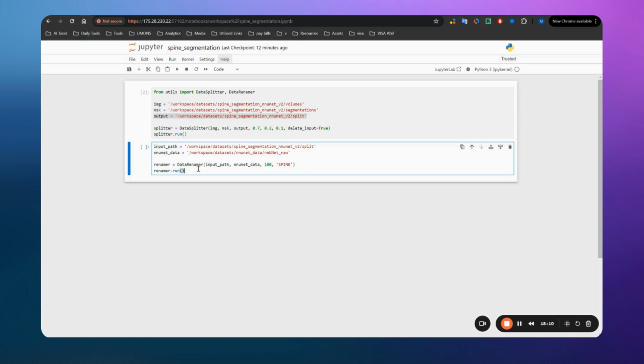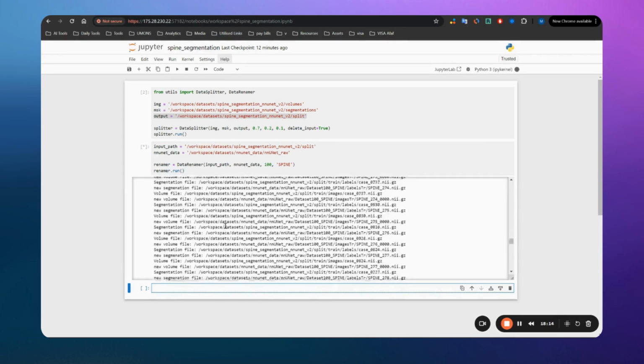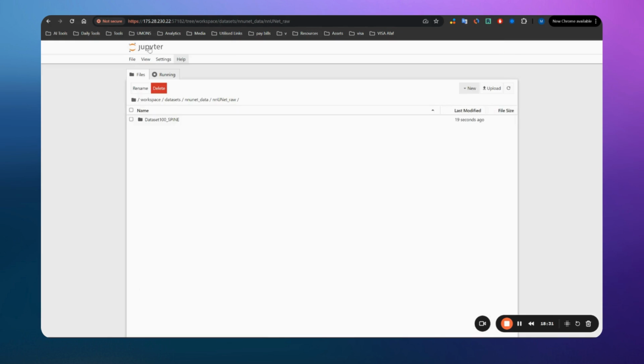Okay, let me run it and see the whole process. So the whole process is happening here. Let's just wait until it completes. Okay, so the process is done.